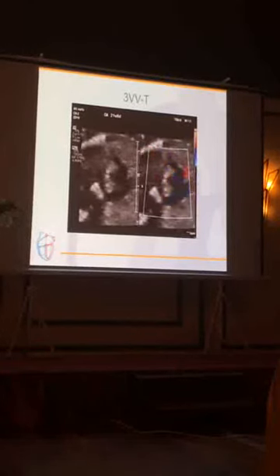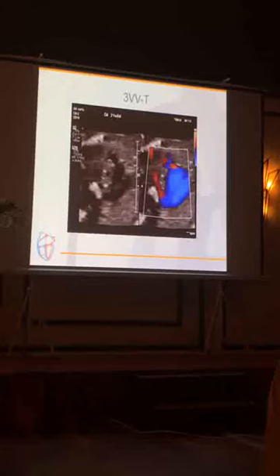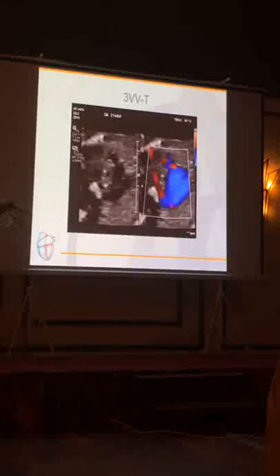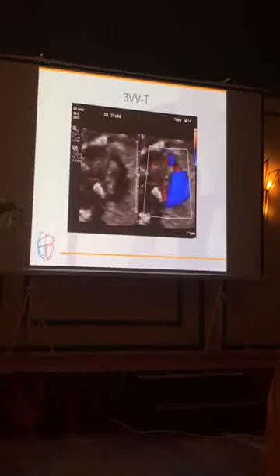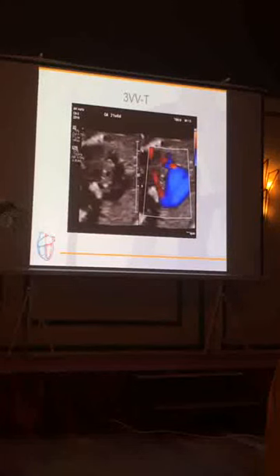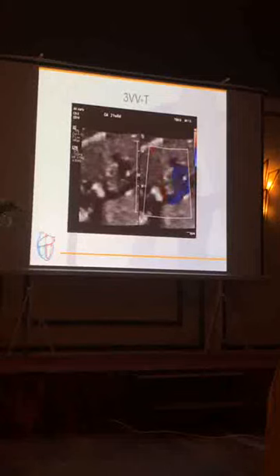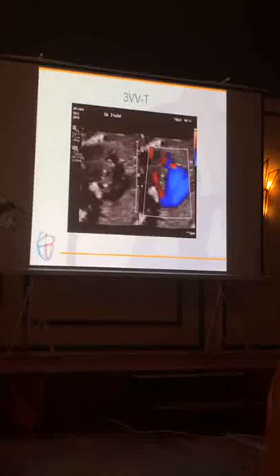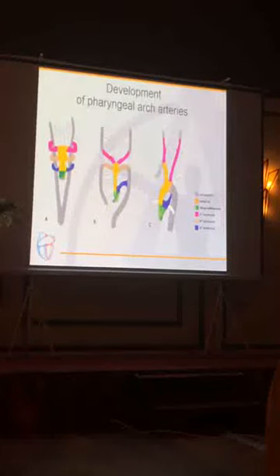Okay, this is something you know already perfectly. Aberrant. Learn about it. Yeah, the ductus arteriosus, the aortic arch, the SVC, the trachea, and a vessel behind the trachea, which is the aberrant right subclavian artery. And it brings us to the next part, which is about the aortic arch and its developmental abnormalities, not coarctation or interruption, but purely the maldevelopment of the aortic arch.